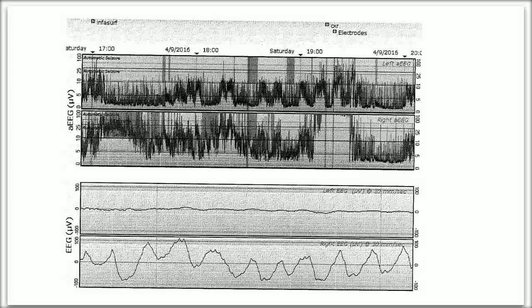Then it shifts back down and it comes back up. It's a kind of messy trace. There's certainly some areas that are suspicious, but there are also some areas marked by the nurses with chest X-ray and electrode repositioning that rule out those areas as ones we would really want to interpret. So I think mostly this is too disrupted to really accurately assess.